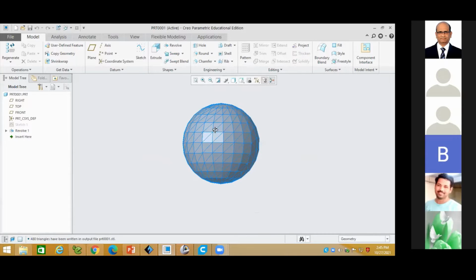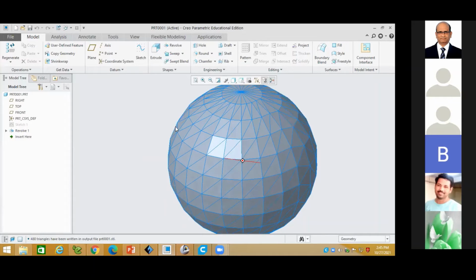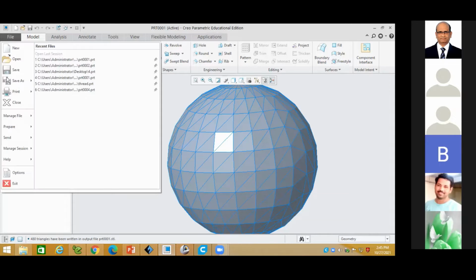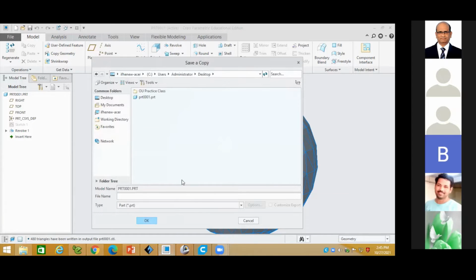No, because now you can see there are some errors. It is not exactly a curvature. Here some linear shapes are there. So I wanted to reduce these errors. Almost 70% of the people who don't know 3D printing just convert the STL file and go for manufacturing. But when we convert the STL file, you have to take care about this accuracy. If you get inaccuracy in your STL file, you will get inaccuracy in your 3D printed model. So when you are converting, you have to reduce as much error as possible in your STL file.